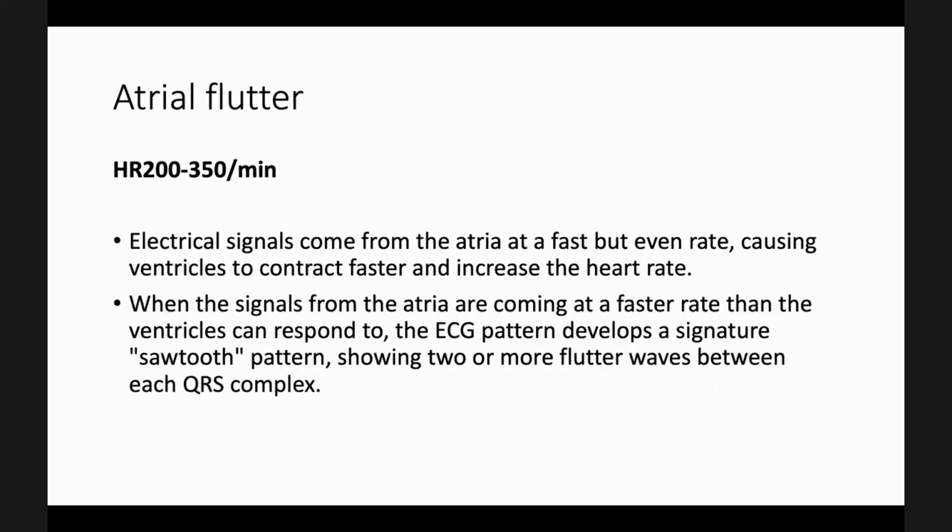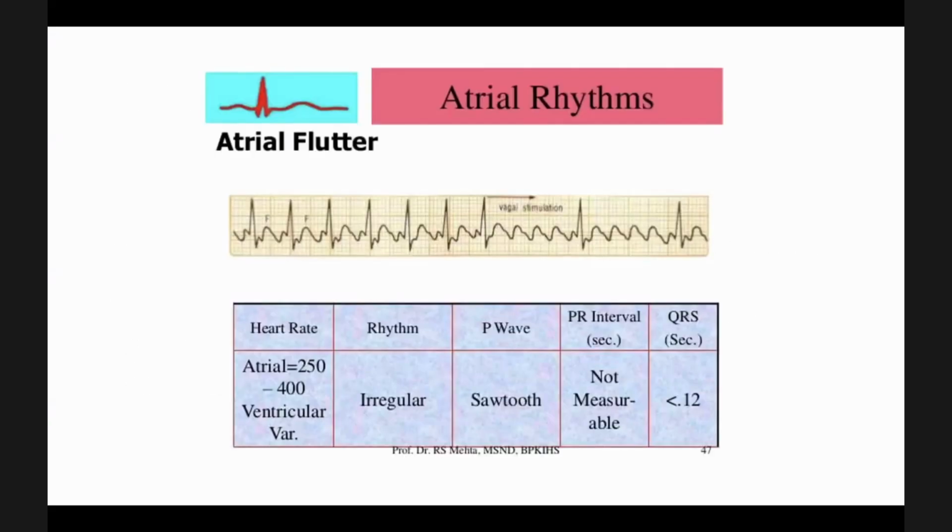So atrial flutter is another one, probably that you all have seen during your physiology appointment. The rate, again, is rapid when they come with the acute presentation. How do you diagnose it on the ECG? You see a sawtooth pattern. So very easy to diagnose.